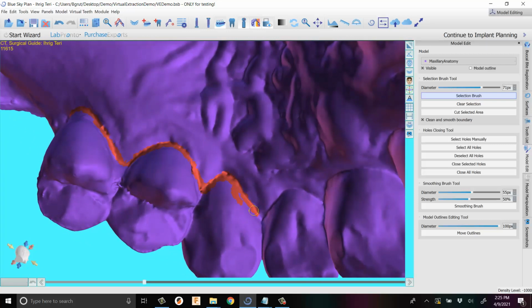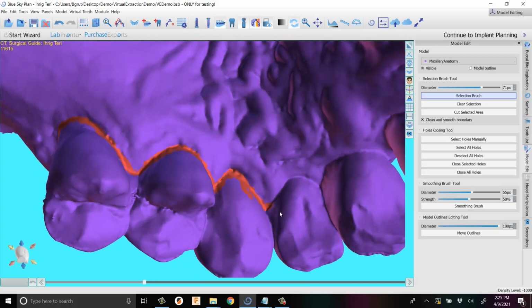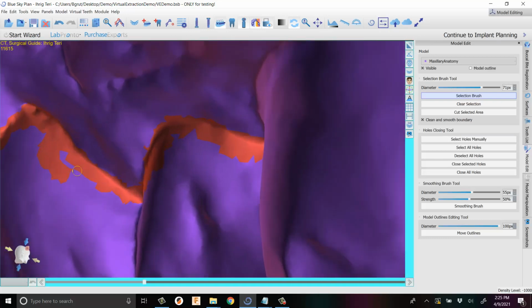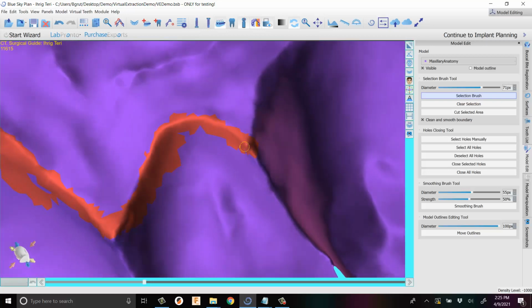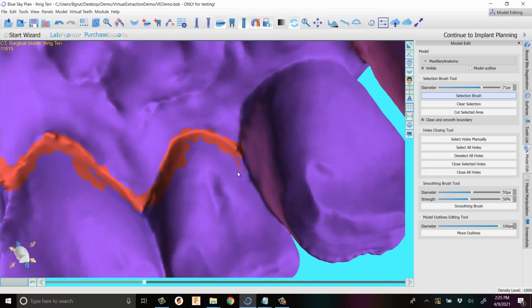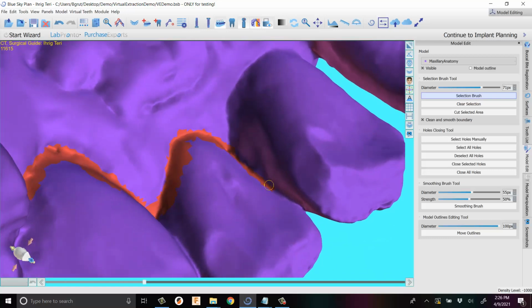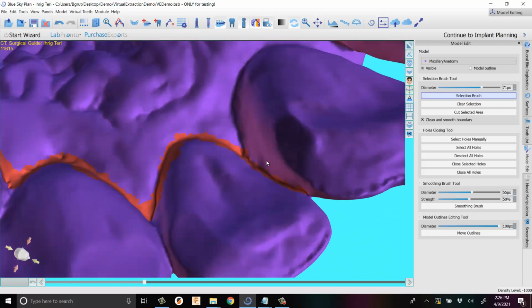If you over highlight, who cares? In fact, I'm going to show you a problem with that over highlighting that I just created that I could fix right now. I'll tell you what I should fix, but I'm not going to actually fix it. Okay, so you see how it's connected? There's this little lone piece right there. You've got to realize that's not going to get deleted, which is, I'm going to show you what kind of problem that causes in a minute. It's not a big problem, but it's a problem nonetheless.